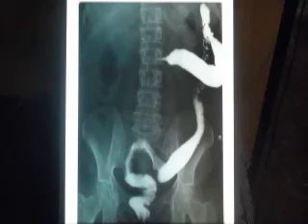So the cause of this loss of haustration is ulcerative colitis. It has this pattern of loss of haustration, and it can lead to cancer colon. So it's cancer colon on top of ulcerative colitis, and this is very important because it will change your line of treatment. If you have only obstructive cancer colon, you can deal with the cancer and treat the obstruction.